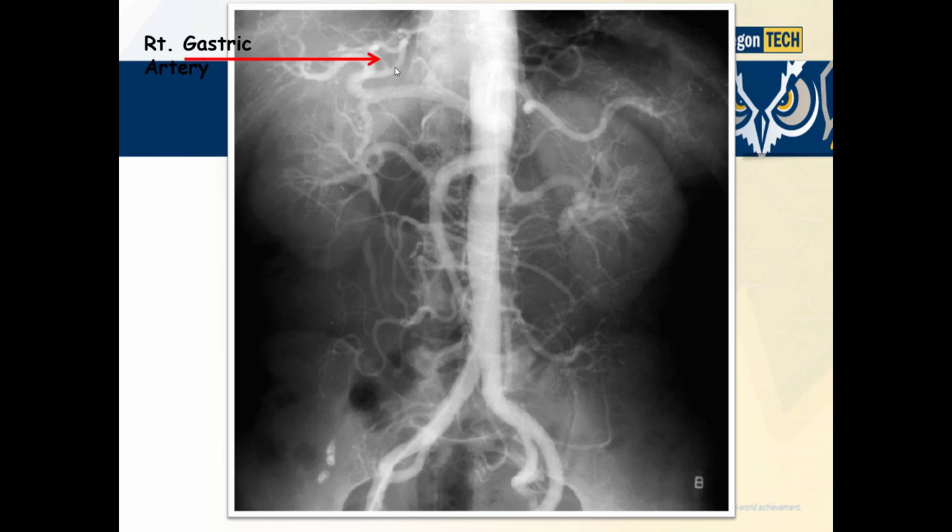Here's the right gastric artery coming off. Right here, right here. And the gastroduodenal that I already pointed out to you. Here's that right hepatic artery, and this would be the left hepatic artery. Right there.